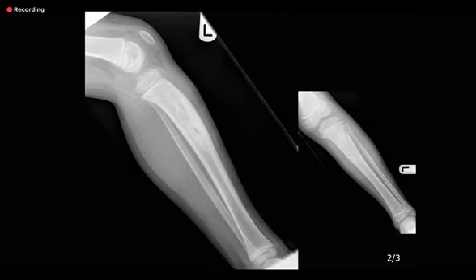I think I can see a possible nidus in this region. It's more convincing for nidus than the first case, and the cortical response appears quite smooth and well defined. Given these appearances, I'll correlate with the history to see if it is in keeping with an osteoid osteoma in this case.